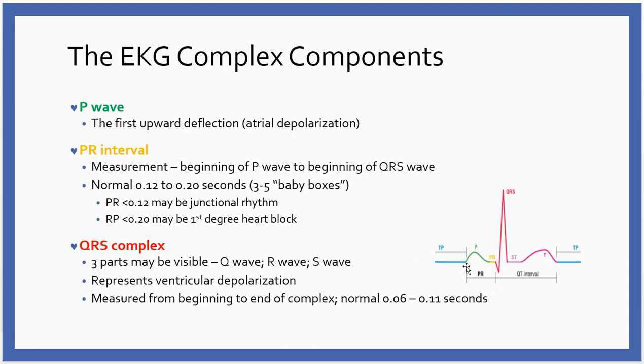Back to the P wave. So this is atrial depolarization, meaning at this point, the SA node fired off, and then what we're seeing is that energy moving, that depolarization wave through the atria that creates this bump. And remember, that's going to be sodium moving into cells, potassium moving out. Contraction will follow that. Then we have a little pause because there's nothing going on electrically. Remember, there's a little pause in the AV node, so the AV node gives a little bit more time for the ventricles to fill. So we've identified the P wave, and that's our atrial depolarization. We have the little pause.